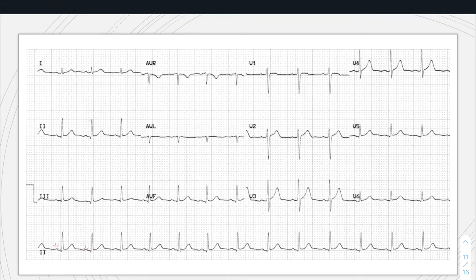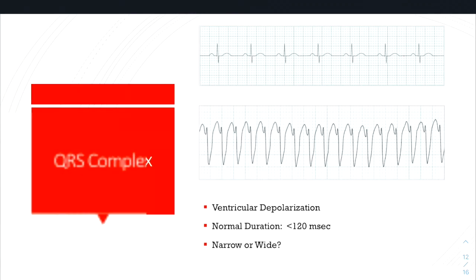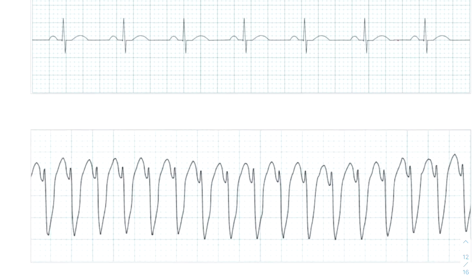There's a P wave there, P wave there, P wave there. And you can see just all the way along, you can get those indications of present P waves along the entire strip. And then the next thing to look for is, once you've identified the P wave, does a QRS complex follow it? And in this case, yes, we do have a QRS after every P wave, so we know that that's normal conduction. Every atrial depolarization is coupled with a ventricular depolarization. So then the morphologies of our QRS complex.